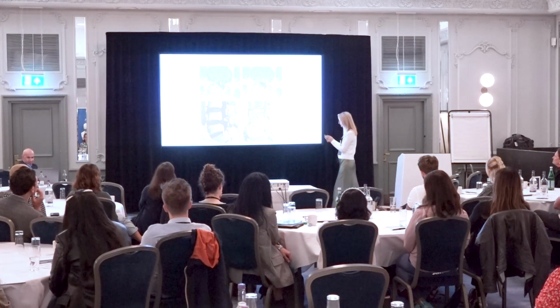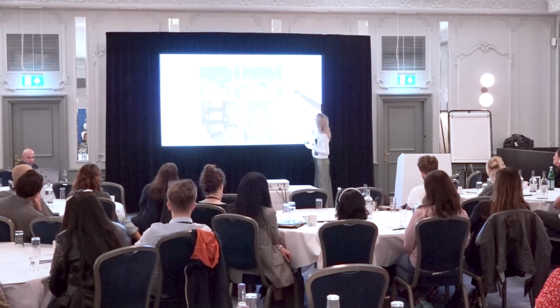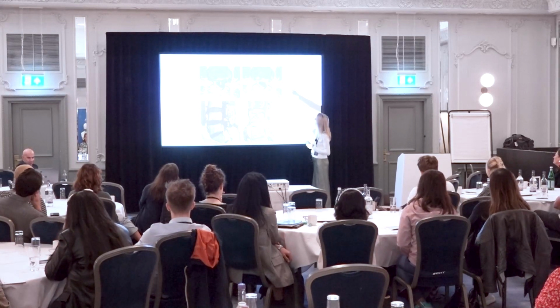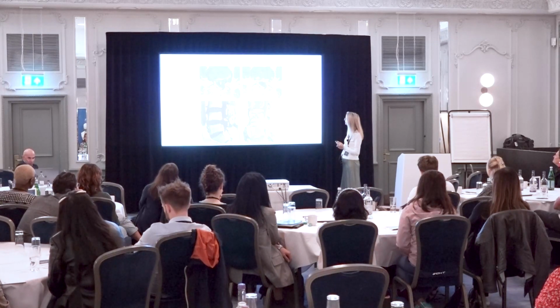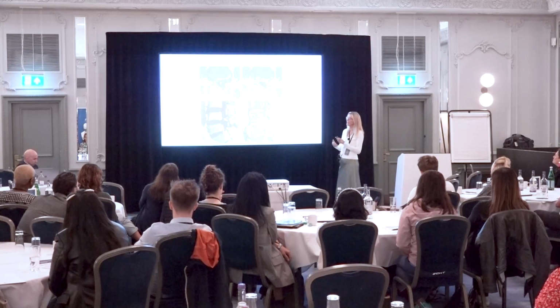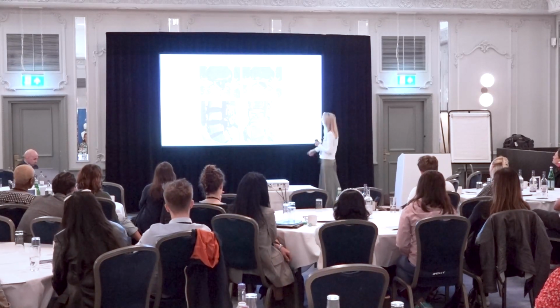So you can see, I slightly wish I had a pointer here, you can see where that arrowhead is. It's surrounded by enhancing scar. That's before contrast, that's after contrast, and that's got a little rim of enhancement around it. So that's a little recurrent disc fragment, and it's touching the nerve root. And what you also see, patients who have recurrent symptoms after surgery often have enhancement of the nerve root.